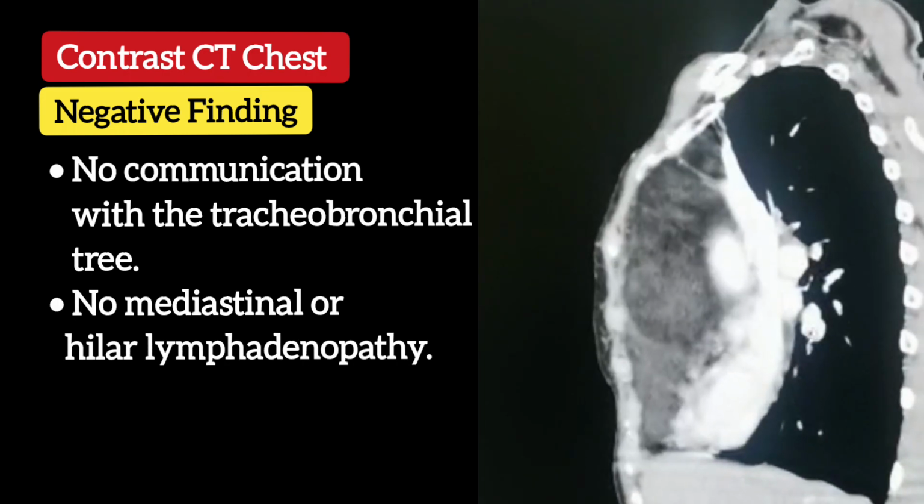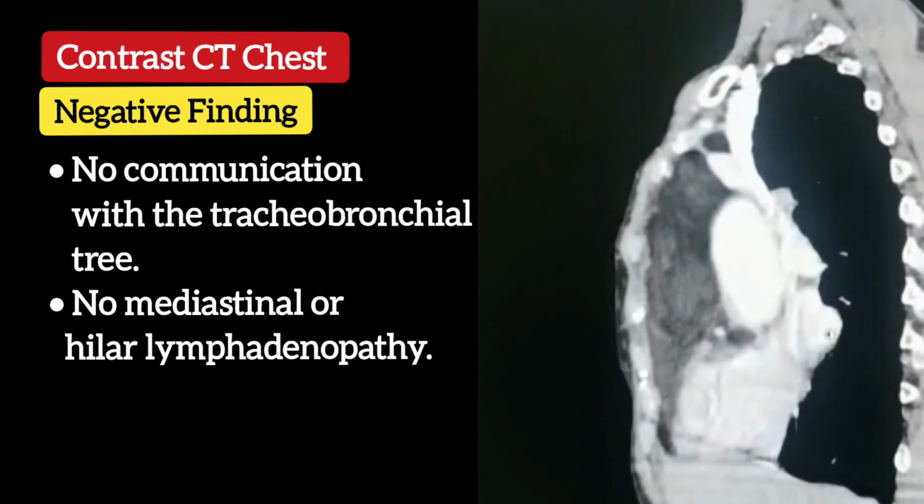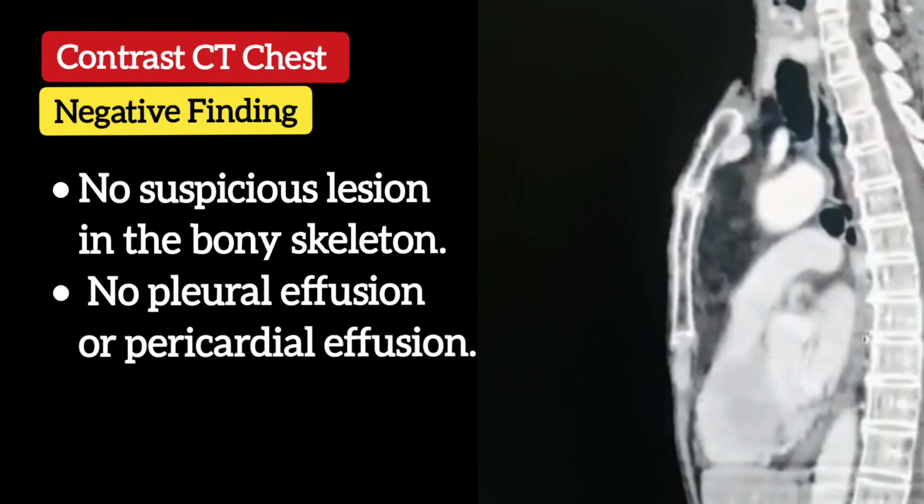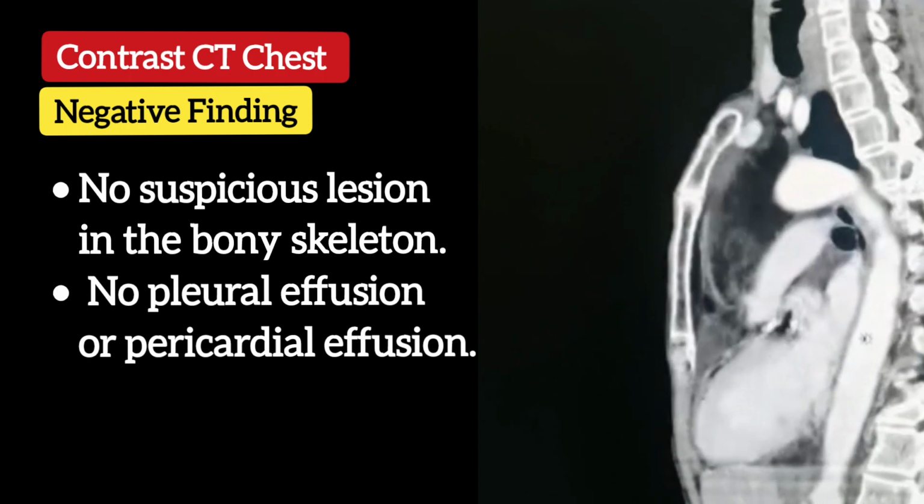No mediastinal or hilar lymphadenopathy. No suspicious lesion in the bony skeleton. No pleural effusion or pericardial effusion.